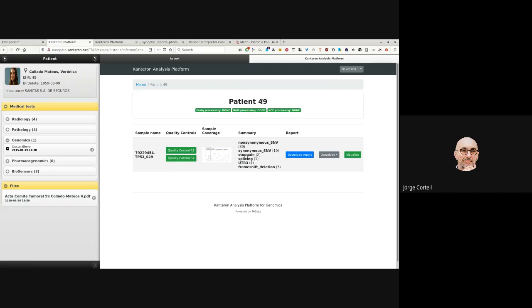We identify patients here by number instead of name, like the other areas. The reason is, and you can see this is the same number, the reason is you could have a family case. You could be looking at more than one patient. And another reason is genomics has particularly strict privacy concerns. Who is the real father kind of thing. So sometimes you don't even want to show the name. So, but we do need to identify the patient. So here we have the correlation between the patient number and this sample number.